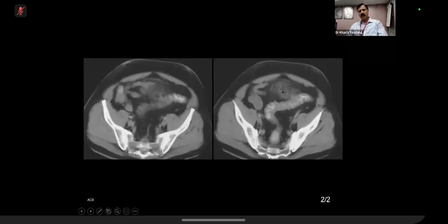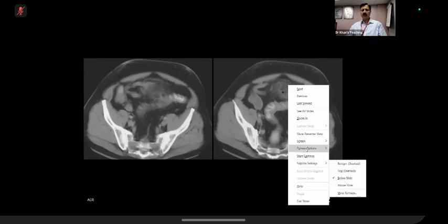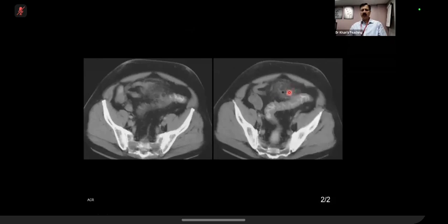Having said that, coming back, please remember the main pathology which happens when we get diverticulitis. Basically, diverticulitis means that there is a perforation of a diverticuli. So initially there must be a perforation, and when the perforation occurs, there might be locule of gas. This locule of gas is sitting in what we call the sigmoid mesentery, and there might be more than that. So don't overcall it. Don't think that this is pneumoperitoneum, because this is in the mesentery of the sigmoid.